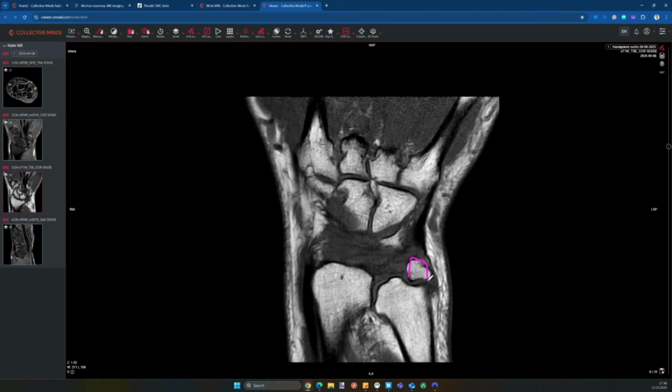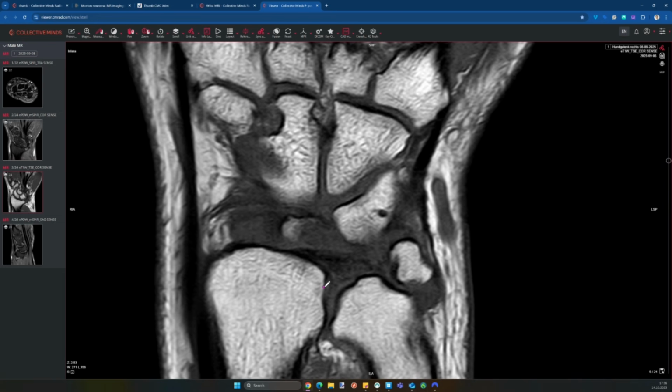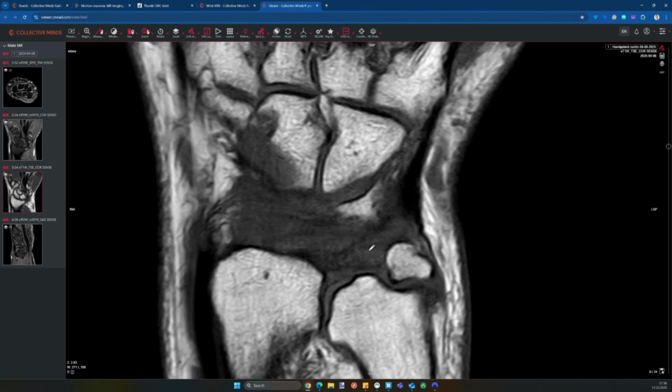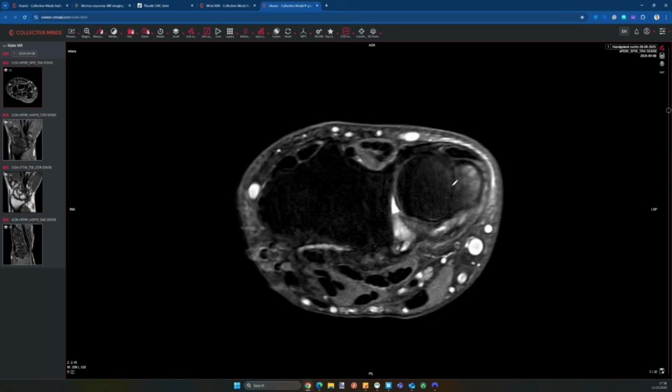And when we have these pseudarthroses or these old fractures, especially when they go through the base of the styloid process, what that means is that basically the foveal and styloid attachment are affected. So this one will go in here, so both are affected. So this makes the TFCC or the distal radioulnar joint unstable, and that's why we see also to some degree, like you mentioned already, dorsal subluxation. If we use these different methods, and the center of rotation would be here, it's too high, so dorsally subluxed.